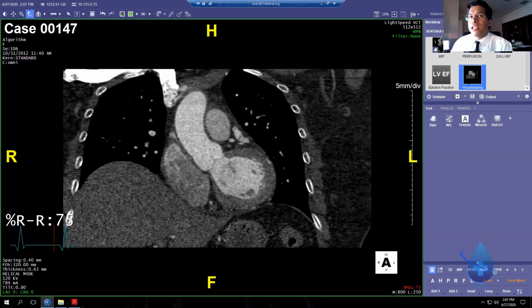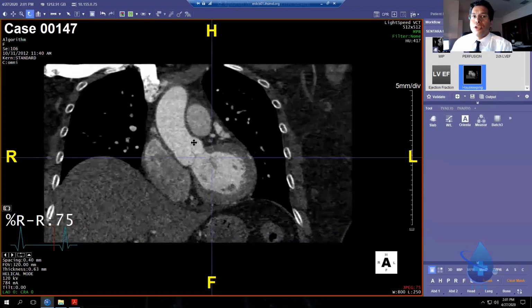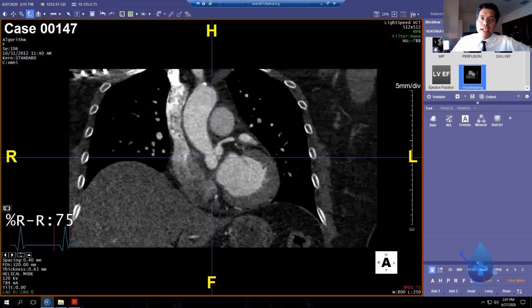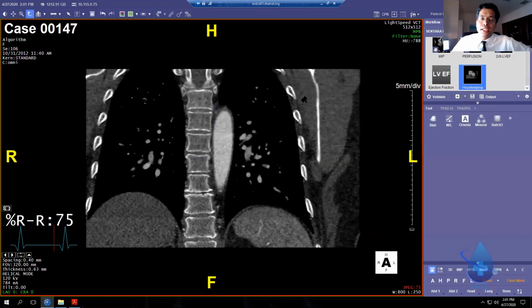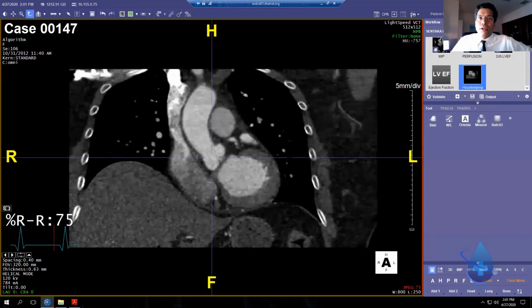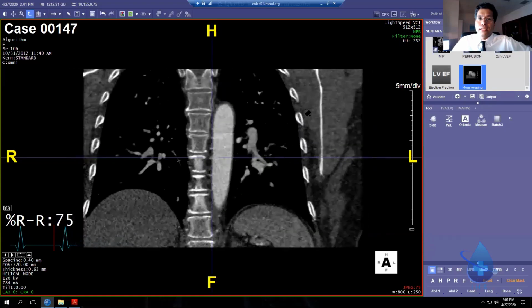So now once you click the housekeeping, we are now going to review the aorta. Now, this is where your liability is, and I said this morning, thou shalt not miss an acute aortic syndrome or a pulmonary embolism. Let's talk about the aorta first. There are 3 planes you have to review the aorta: AP, so that's ascending, aortic arch, and descending. So this is just by right clicking, middle clicking, and scrolling front to back, okay?